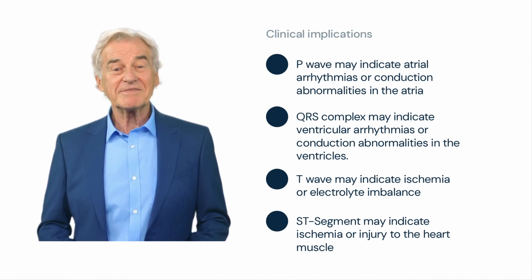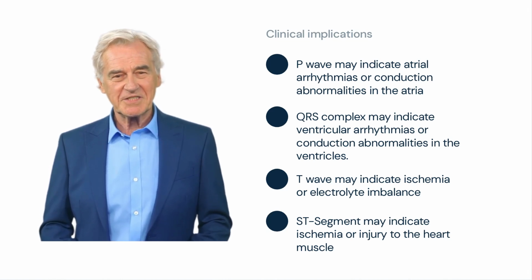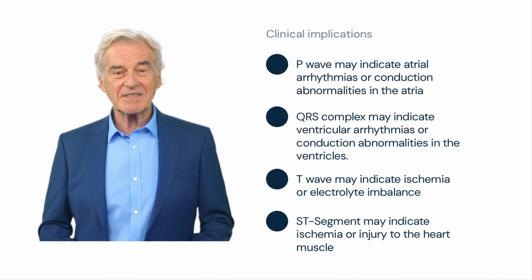In conclusion, understanding the different waves and intervals seen on an ECG tracing is essential for interpreting ECGs and diagnosing cardiac conditions.